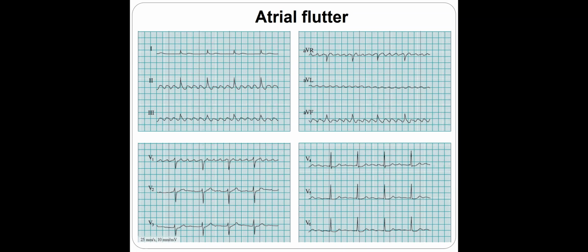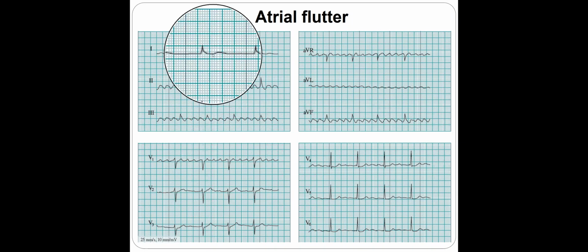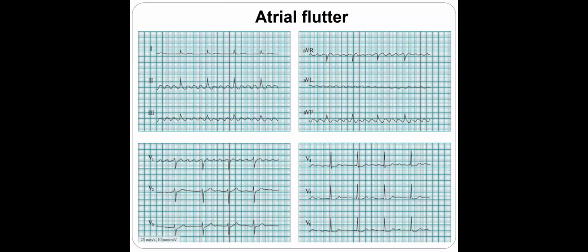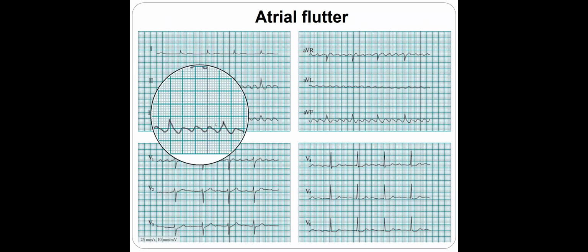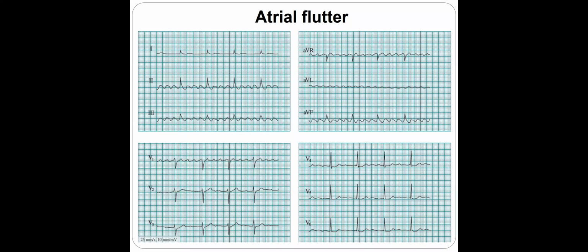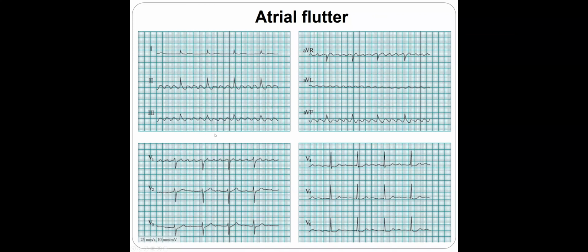And there's no T wave? Well, you can have T waves. I'm not saying that you don't. However, these T waves can be negative or exactly inside the saw waves. For example, here in lead I, you can see the T waves. That's a T wave. If you have a QRS, you have to have a T wave. There's no way that the repolarization is missing. However, it can be hidden inside the saw waves, F waves. Usually these ECGs record simultaneously. This is a 3-channel ECG, but you can have a 6-channel or 12-channel ECG recording at the same time, and you can look at how the T waves and P waves look in all leads. That's very helpful.